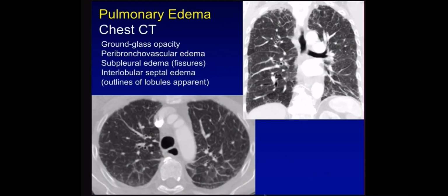If you happen to have a CT study of a patient with pulmonary edema, you're going to see things much more elegantly and in greater detail. You're going to recognize that there's a diffuse ground glass opacity throughout both lungs. Notice how dark the air is in the airways here. Compare that to the lungs, which should be nearly as dark in the normal state. But here we have diffuse interstitial pulmonary edema manifesting as ground glass opacity.